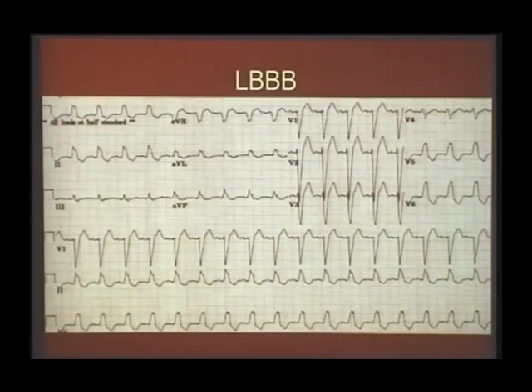So look at this ECG now. The first thing to diagnose is what? QRS widening. See that initial portion there. The initial portion is so sharp. So the widening is due to the terminal delay. So it is a bundle branch block. Once you decide it is a bundle branch block, look at where the slurred positivity is. Is it in V1? No. Is it in V5, V6? Yes. So what bundle branch block is this? It is written very nicely there. So what bundle branch block is this?